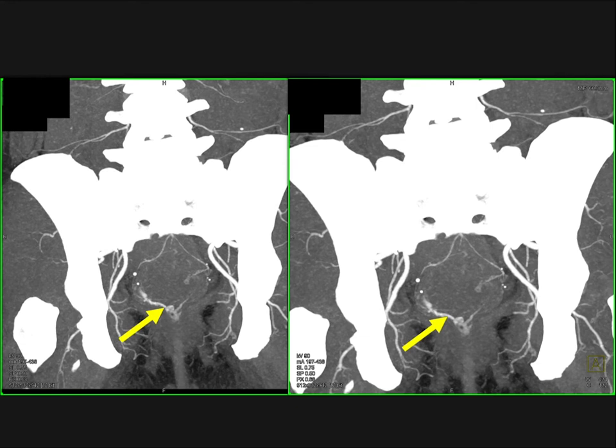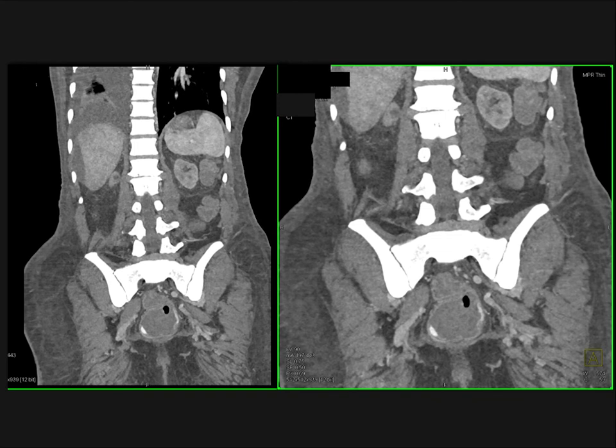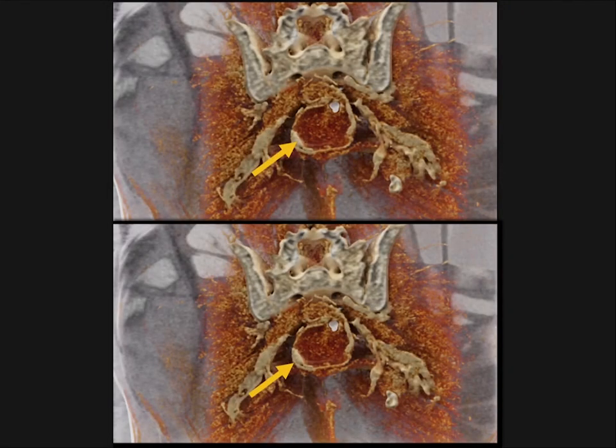It was a small tumor that actively bled. And as you go from arterial to venous phase imaging, the bleeding is more extensive. And this was eventually resected. We have been using cinematic rendering. Look how nicely you see the blood and the site of bleeding on the right colonic wall. So perhaps this can do better. We'll have to see. This case was a very nice example, and the arrows nicely show you the bleeding.